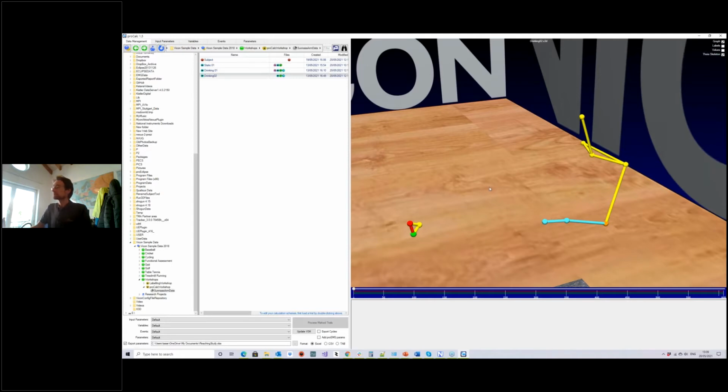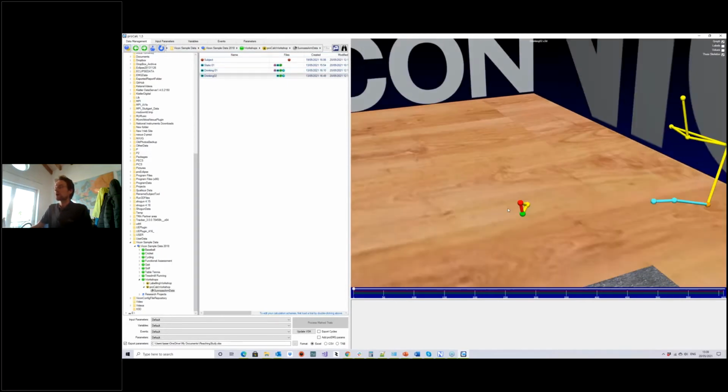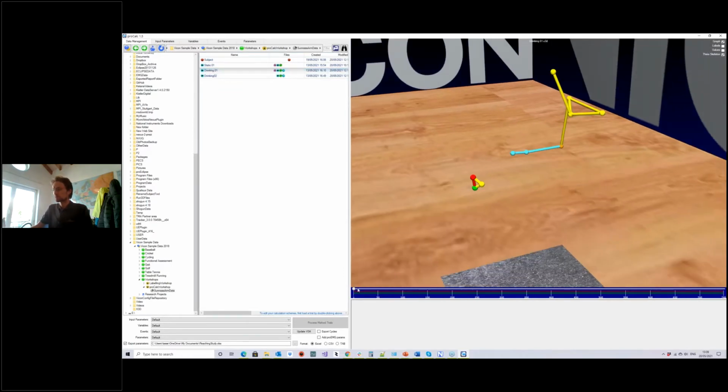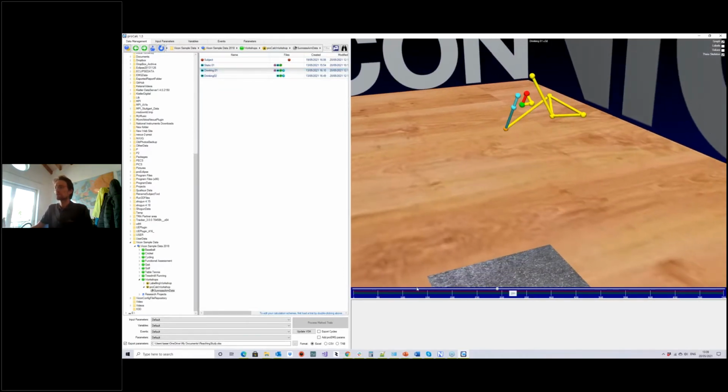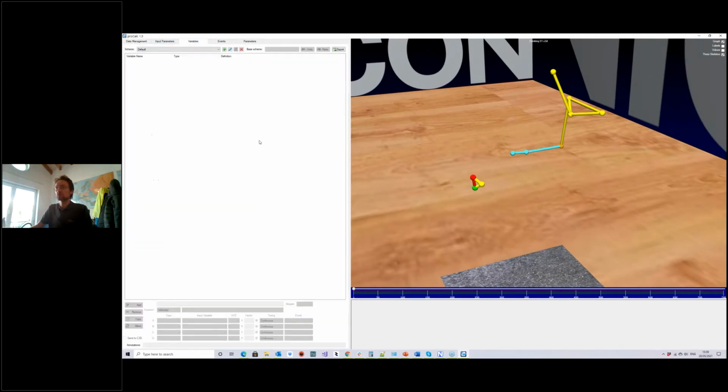Okay, so the first thing we do in ProCalc is to start creating calculation schemes. After we load up a trial like this one and maybe have a look at it, we can start generating variables.